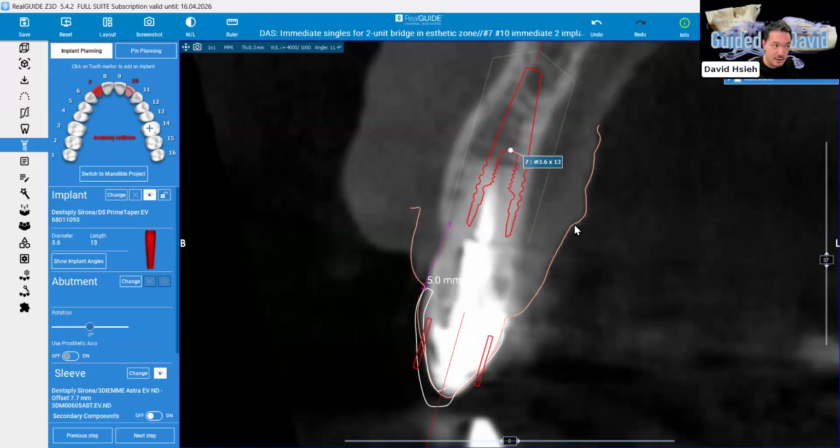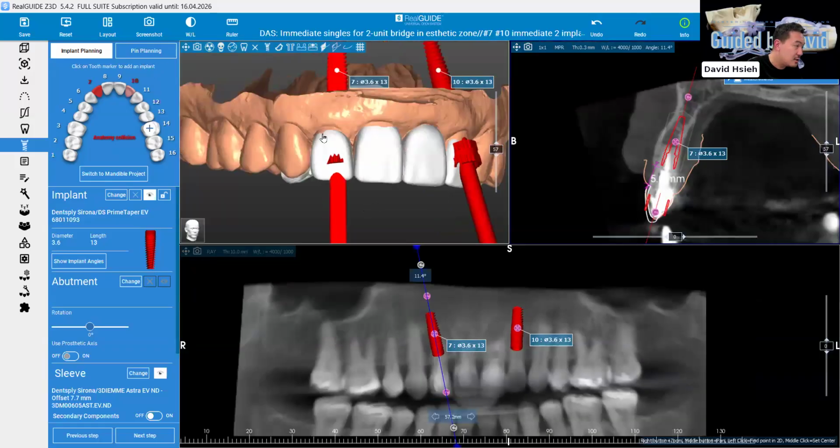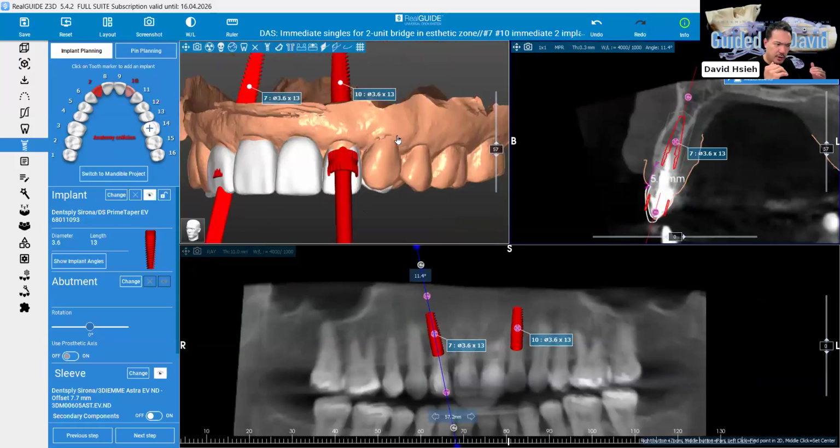Before the surgery really happens, you can really figure out what abutment you're gonna use and how's the contour of the crown, and then the relation to the adjacent. If you need to adjust a little bit, meaning when the crown goes deeper, the gingival zenith will go deeper also, right? So if you want to consider maybe doing crown lengthening at the adjacent, just to make the gum line look more symmetrical, right? If you factor that all in, and you see how much bone you have, then you can maybe figure it out.